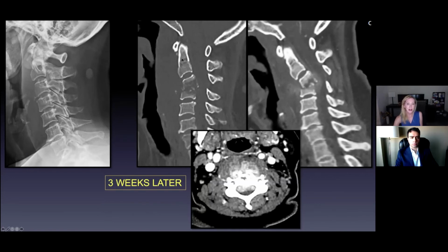But you can see on this lateral view, the sagittal view, as we call it for CT and MR, of the cervical spine, that there have been some changes since that X-ray. Here at the C3, C4 level, now these vertebral bodies do not have normal vertebral body height anymore. This disc is gone. There's no longer normal disc space height. It's not aligned anymore. It's not a straight line like it used to be. So now there is destruction, and there's what we call subluxation of this C3 vertebral body into the spinal canal. And we still see these very prominent prevertebral soft tissues, which is very abnormal.